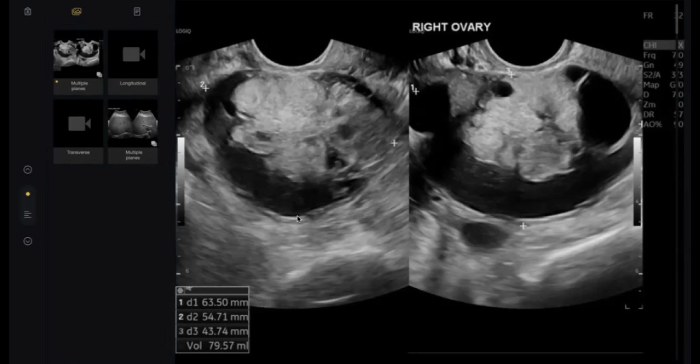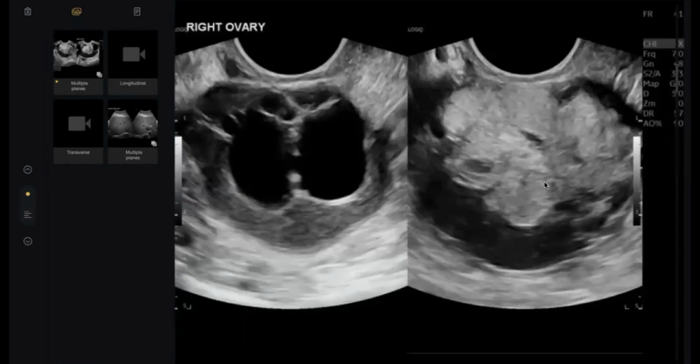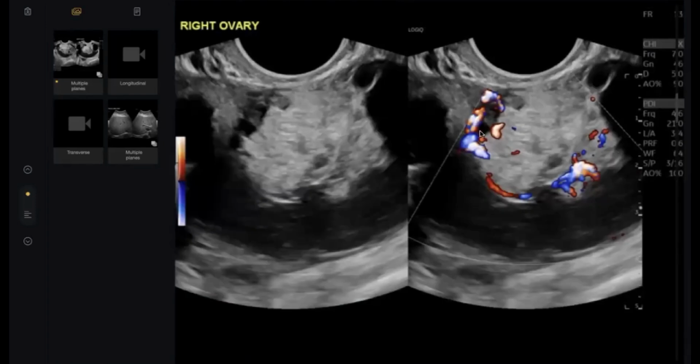I think I can proceed with CT. No. Look here, what happened? What is this box? Doppler. Yes, what color happened on Doppler here? There's increased signal at its periphery. What is this, doctor? This is not only periphery. There are multiple vessels within the lesion as well.